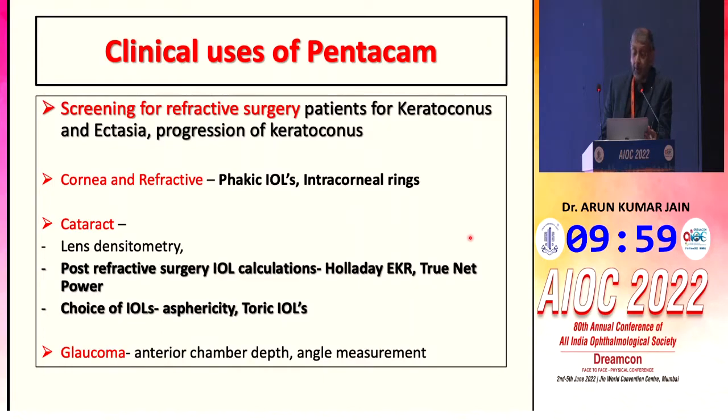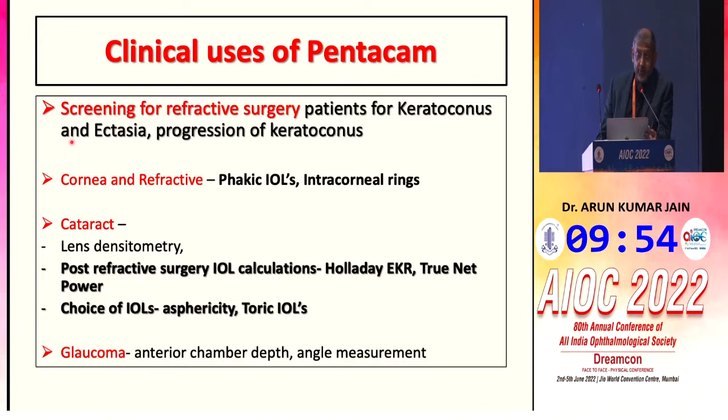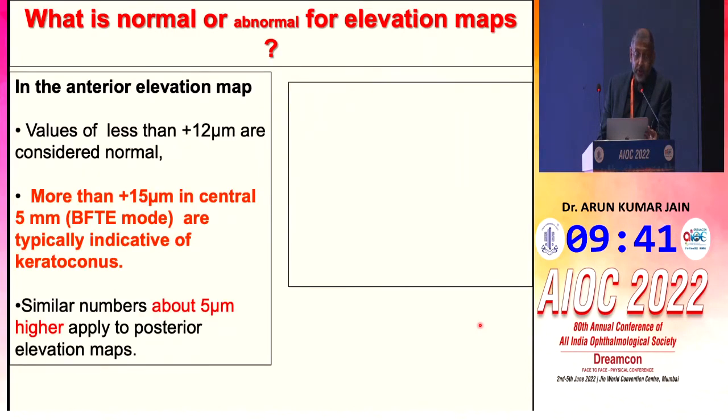There are a lot of applications even in glaucoma. So I will be restricting myself only to these three: screening for refractive surgery, post-refractive IOL calculation and choice of aspheric IOL. Coming to the first topic of keratoconus screening.